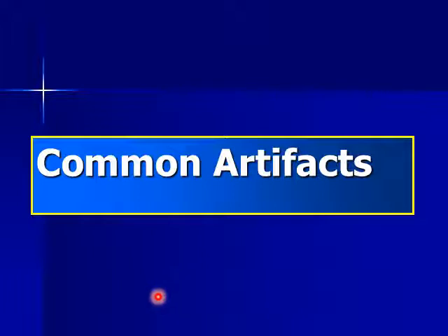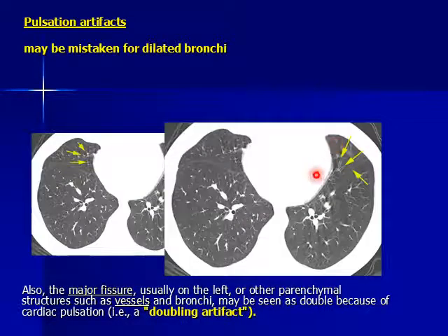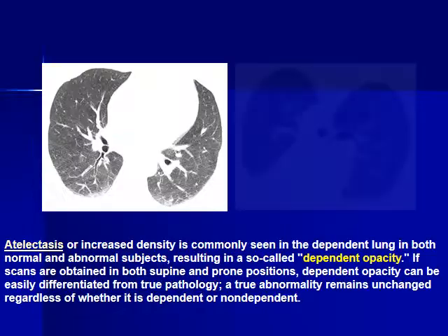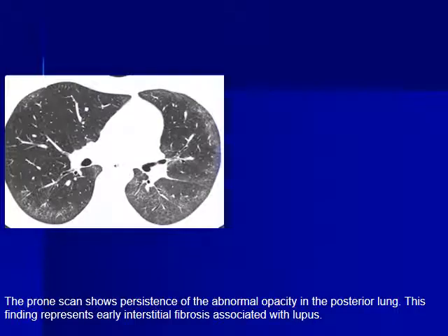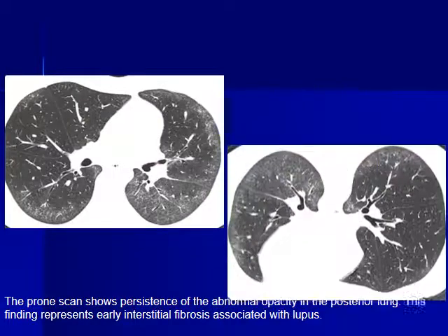A good radiologist is the one who can identify artifacts and not over-diagnose them as pathology, because they are just artifacts. For example, the physiological atelectasis that disappears in the prone position.